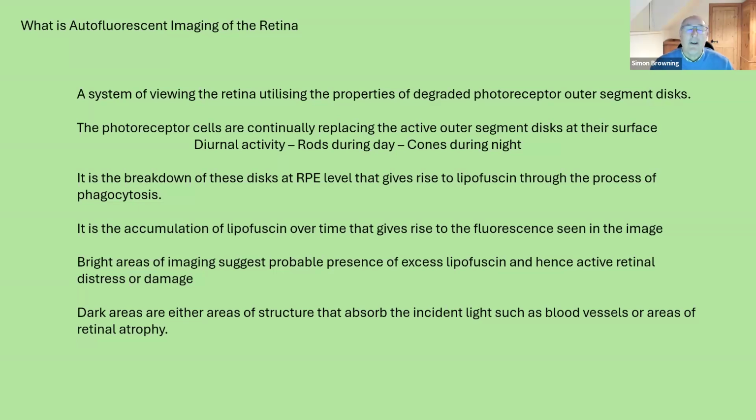And this is really important because the cell's still metabolizing, but it's building up this toxic waste product inside its cytoplasm. So the cell's becoming more and more toxic over time. So that brightness is the cell sort of screaming at you and saying, help me, I'm not feeling good, I'm in trouble. And there's where we get an opportunity to intervene at that stage.